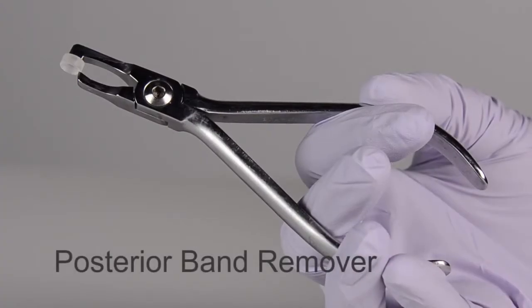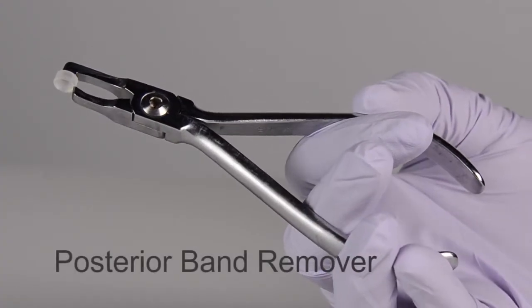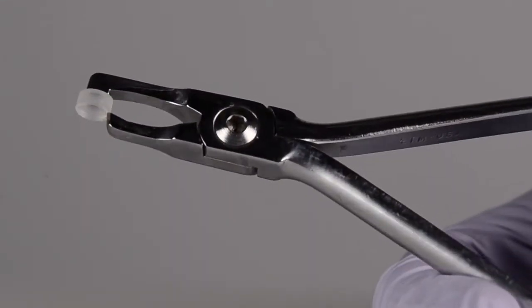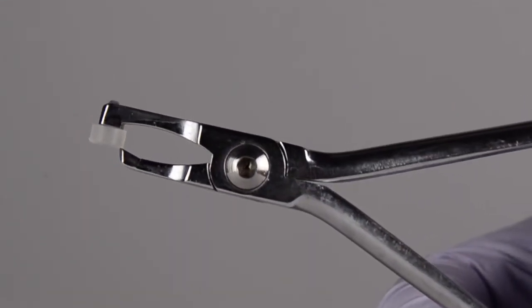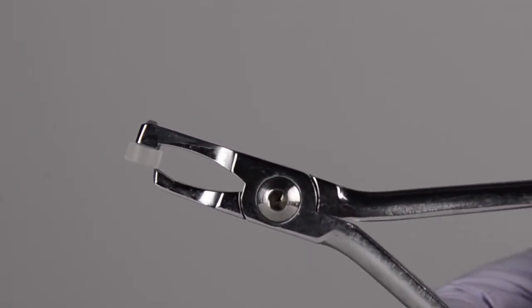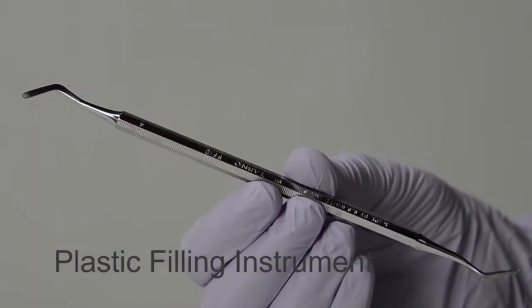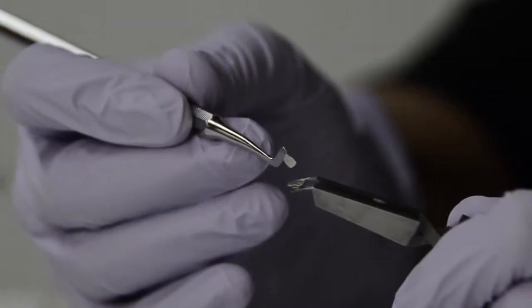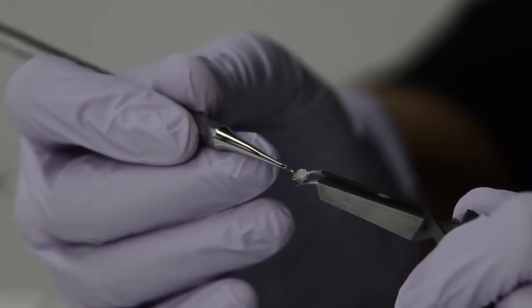The working end of the posterior band remover has a nylon-tipped beak and a flat beak, which has a slight curve at the tip. This is used for the removal of orthodontic bands on posterior teeth. The plastic filling instrument is used to place composite onto the mesh pad of an orthodontic bracket prior to the bonding of the bracket.